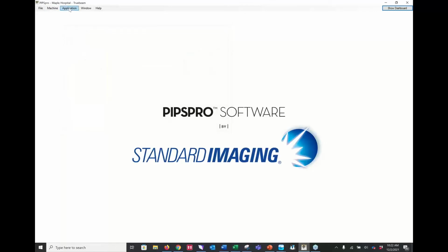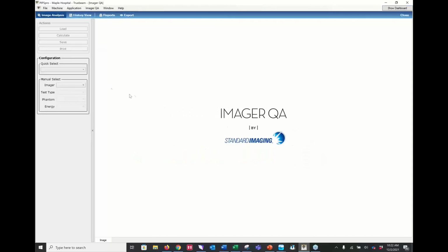Just to give you a couple examples of some of our tests we do. We have the imager QA, as I had mentioned. I'll touch on that. We've got the quick select. So once a baseline is set within the software, you can go and choose those quick selects. So here I've got a QC3, which is my MV test. I've got my QC-KV, which is my KV test, CBCT test as well.